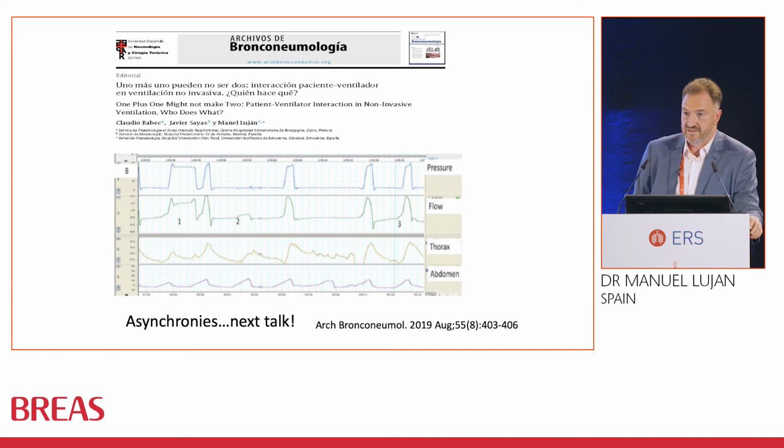Third box, or third situation, asynchronies. There are sometimes complex tracings like this. For example, look at these 3 points in which it could also be important to have the information of the belts, but this is a topic of the next talk.